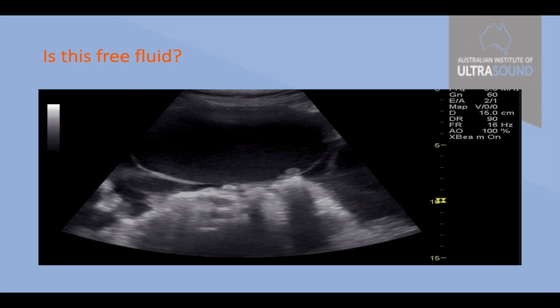Here's another one. This is suprapubic transverse, and we can see a large round mass. You'd be forgiven for thinking that might be bladder, but the wall's too thin. But if you look underneath it, you'll also see what looks like tiny triangles of fluid on the right and the left, which is the fluid from another part of the cyst that's ruptured out. So here we've got both contained fluid and free fluid.